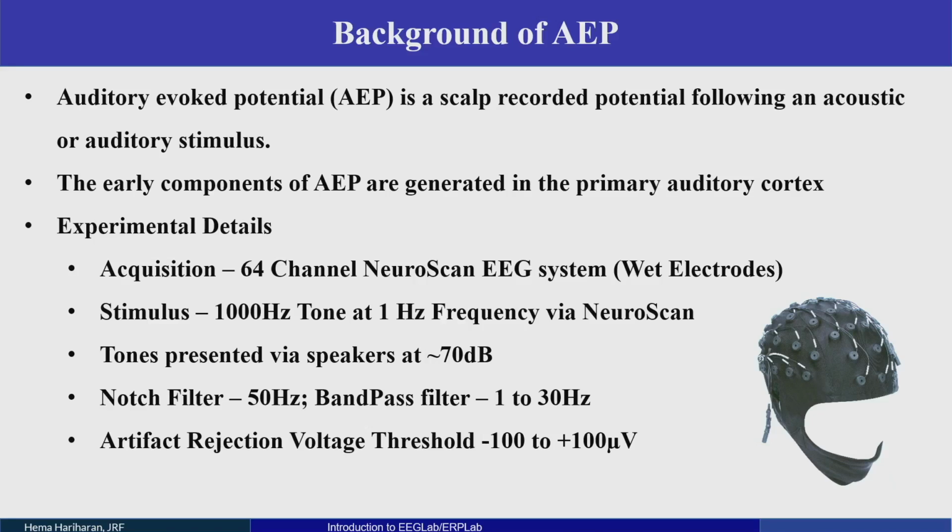In the Neuroscan acquisition system itself, we can assign various parameters. For example, if we want 64 channels, we can give that configuration, or it can be a 32 channel configuration, or even if we want only the frontal electrodes, we can give just 3 electrodes for the forehead, just forehead bands. The configuration can be given in that manner.